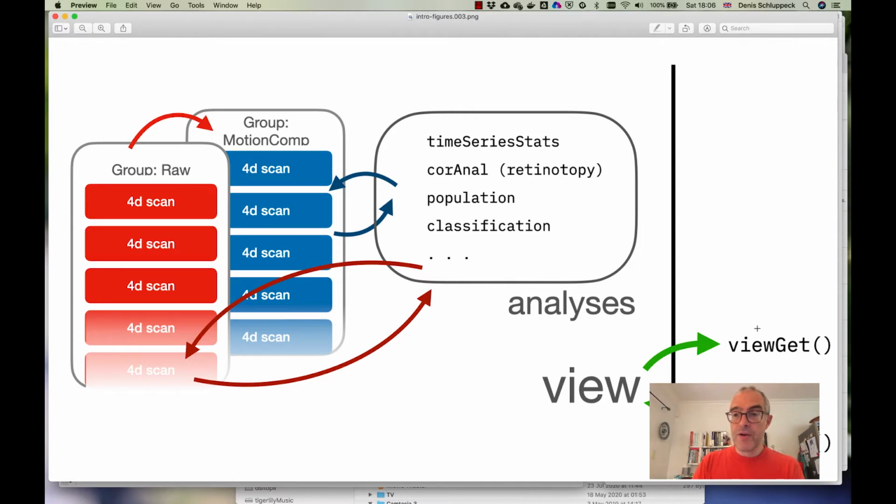Okay, so I'm going to switch to MATLAB now, and I will load in the mrLoadRet window, and then we will get hold of a view of the data and store it in a variable. It's a MATLAB struct, which is a nested data structure that contains lots of information in various fields. And then after we've done that, we're going to try and query some aspect of the data using this viewGet function. Okay, I just want to show you that.